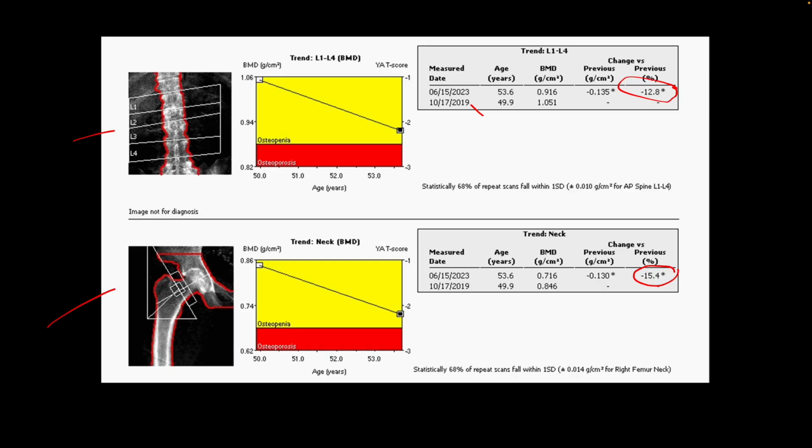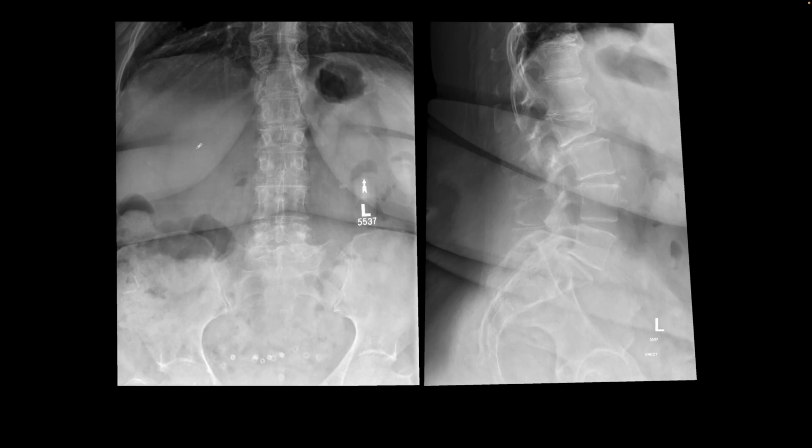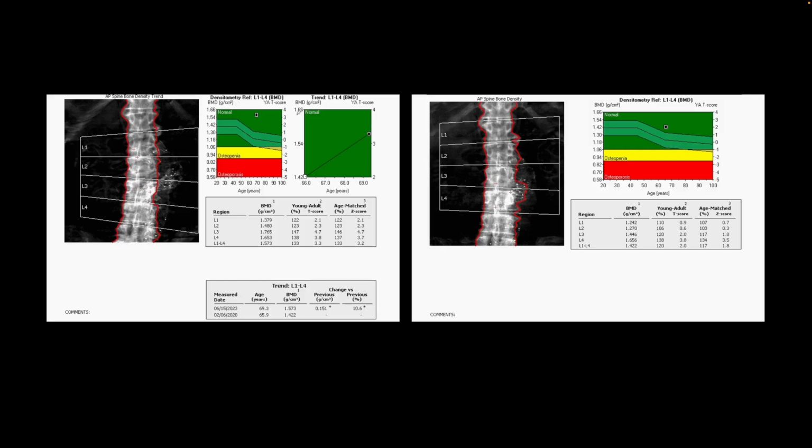When we look at the spine, we find that L2 vertebral body is vertically narrow compared to the vertebra above and below. And so it's important to recognize insufficiency fractures on these images. So L2 has a compression deformity, and this is a correlation with their plain films, where on this lateral view we find that the vertebra is compressed, and we see that finding also right here on the frontal projection.